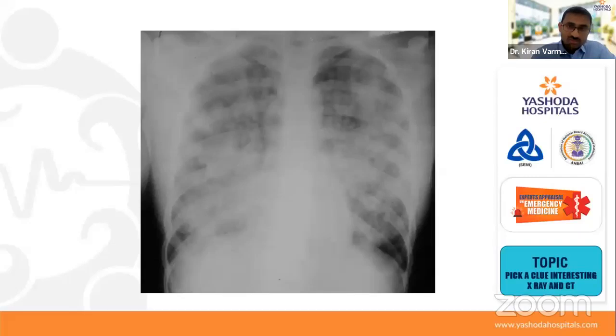Pulmonary edema is usually located in the central, bilateral, perihilar region. So it gives the appearance of batwing. So batwing appearance goes in favor of pulmonary edema. Then a picture like this, it is diffuse, not only located in the center, but also scattered in the peripheral zones. So cotton woolly spots go in favor of ARDS.